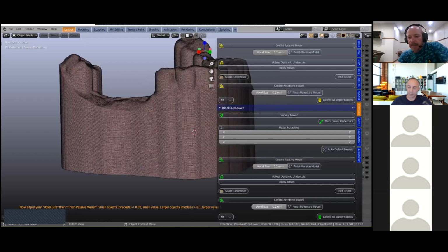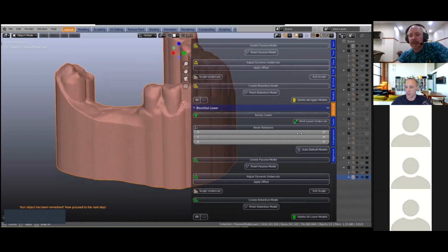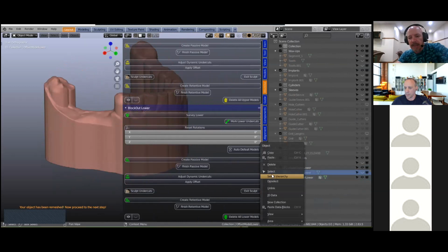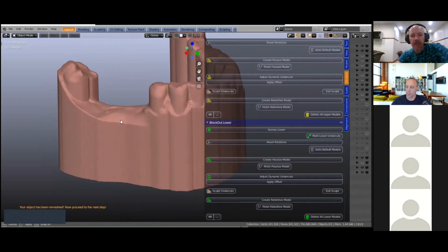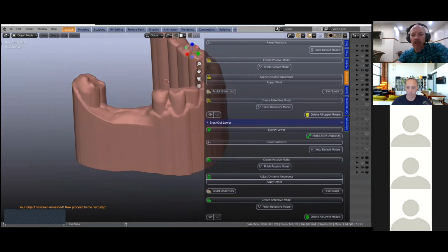All right, so we've just finished this model. Okay, am I online still? Yes, yes, yes. Okay, it makes 3 different models. We're not going to use this one. We're going to be using this specific one. The reason I'm deleting it is that we don't want Blender to slow down too much, so we always want it full speed ahead. All right, so this is the model we're going to be using.